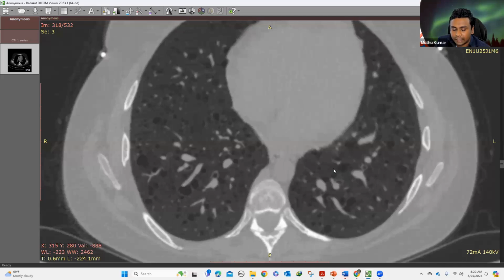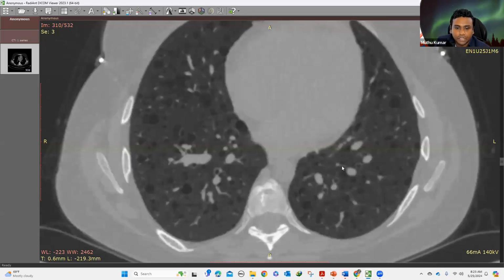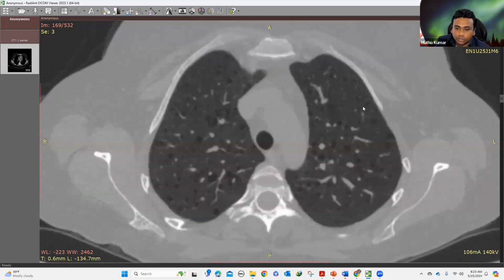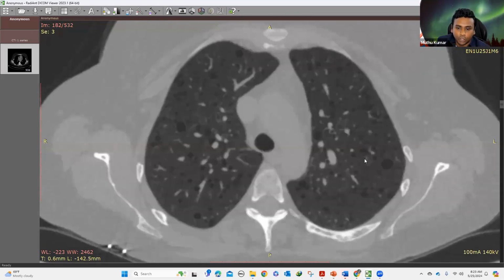The other important cystic lung disease is LIP. What LIP will have is large perivascular cysts. So this patient, you're having uniform symmetrical cysts distributed throughout the lung parenchyma: lymphangioleiomyomatosis.